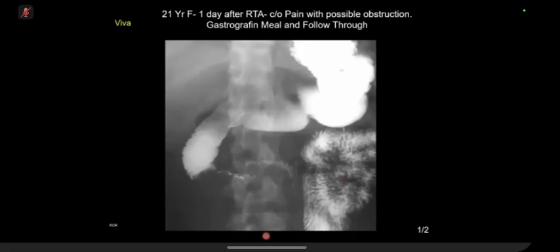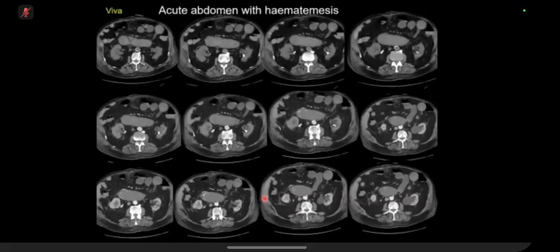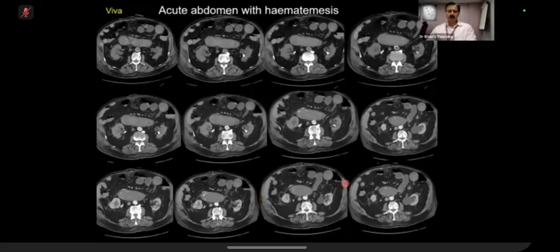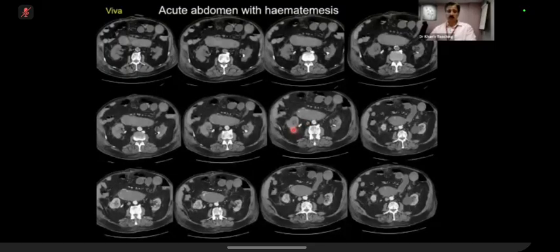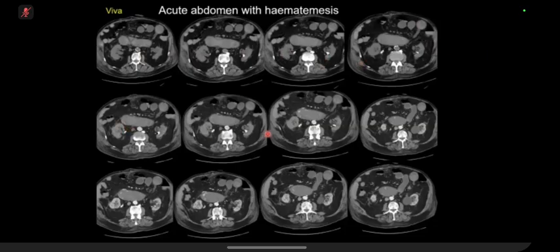If number 7 is with us, raise your hand. Okay, now, can you hear me, candidate 7, please? Yes, sir. Okay, if you see here, because of time factor, I am going to tell you that this is a non-enhanced phase. This is an arterial and slightly delayed. Over to you, what's happening?